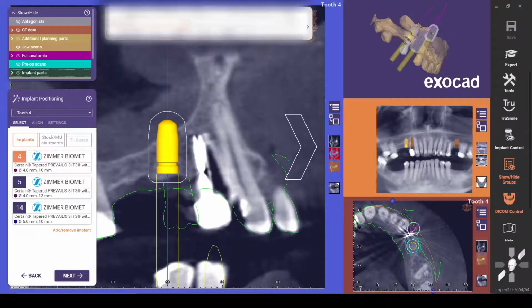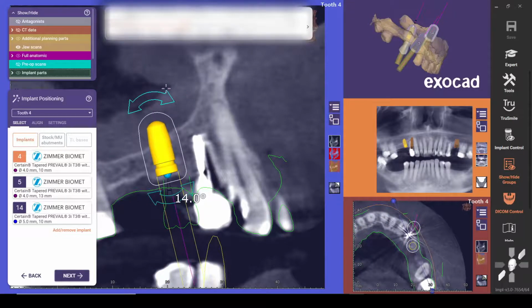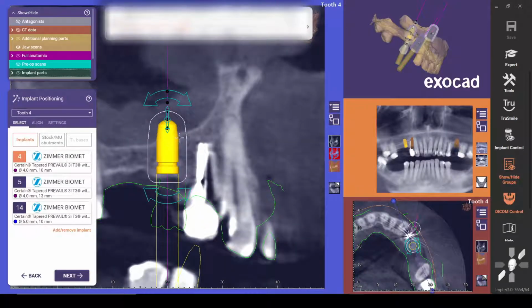This is sort of looking from a periapical type of view. Change this alignment. We may find that these implants end up being too close to each other, so we may need to change our implant diameter. I may not be able to use a 4-3 platform switch. I might have to use a 3.